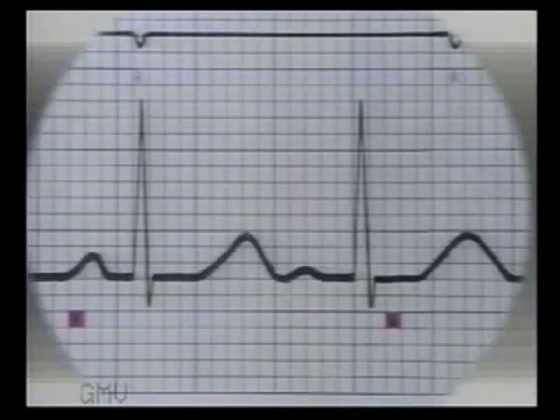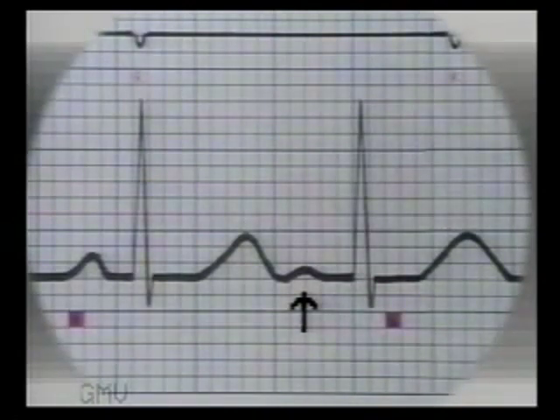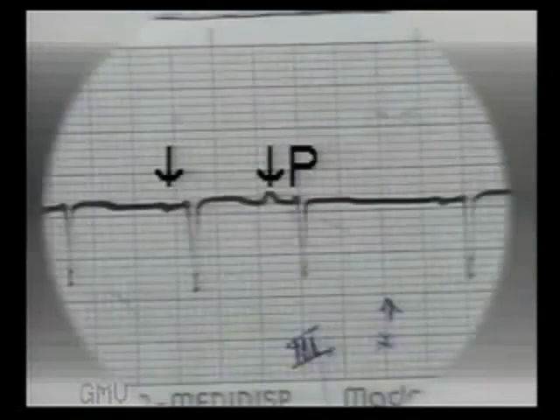It may be merged with the previous T wave. When the QRS complex of the premature beat has normal configuration, the beat is supraventricular. Its site of origin can be determined by studying the P wave. In this premature beat, the P wave is similar but slightly different from the other sinus beats. So this is an atrial premature beat. Note the upright P wave slightly altered in an atrial premature beat. The PR interval is normal.